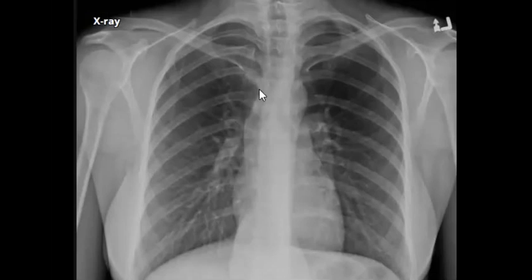So check for the lines of the mediastinum. If you remember, posterior and anterior junctional lines, paraspinal lines, paratracheal lines. You remember? Ah, perfect, Huda. So which paravertebral line, paraspinal, which one is affected?